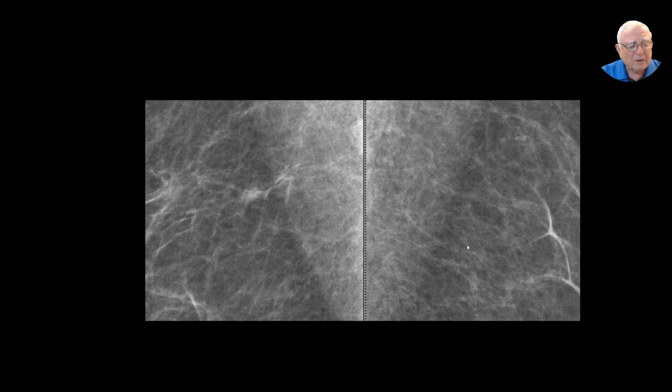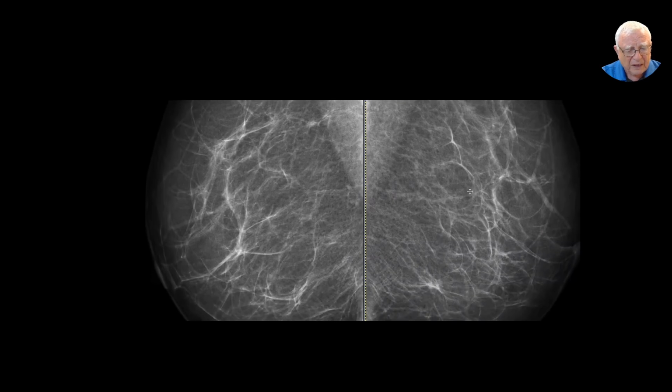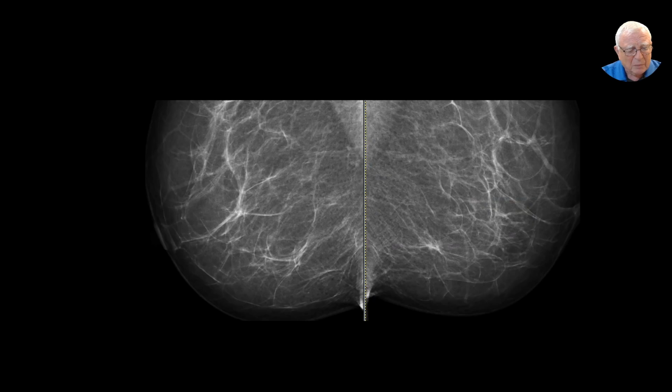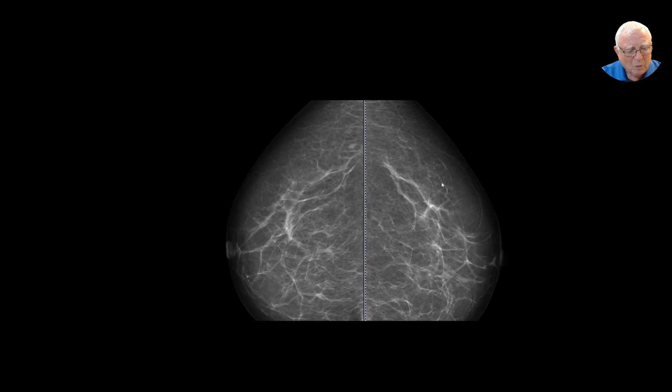There is a non-specific asymmetric density, ill-defined and convex contour in the place where 61% of the cancers grow. Why didn't you pick it up? Nothing behind the nipple, nothing in the lower half of the breast. But in the lateral half.